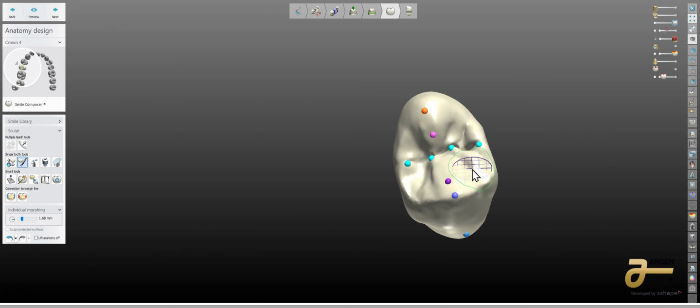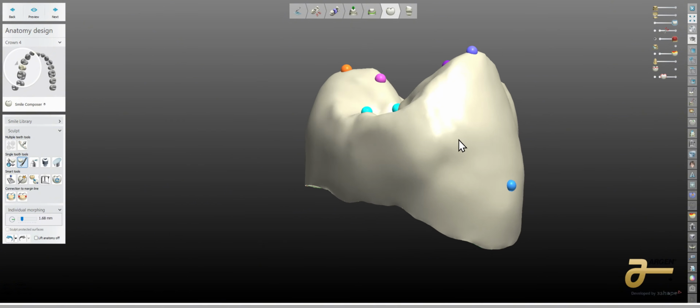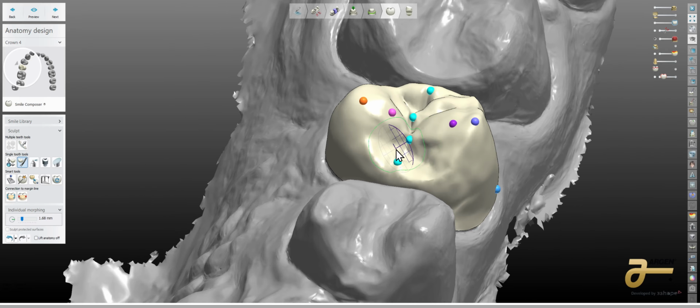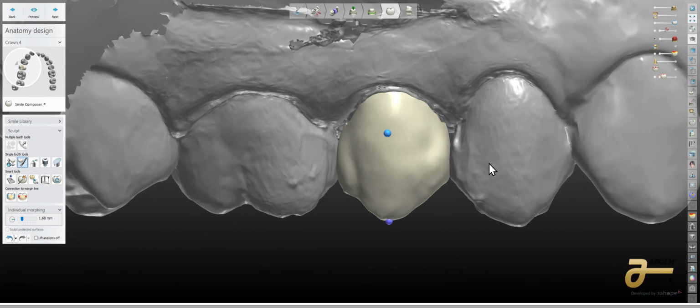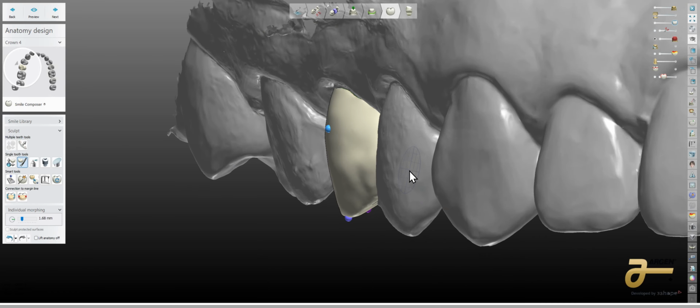If you take the time and look at it like I've described it to you, I'm spending 17 minutes talking about a single unit. And why this is important is because this transcends just filling the space and making a Band-Aid restoration. All of these things are going to aid you in being a better technician and a better digital designer.